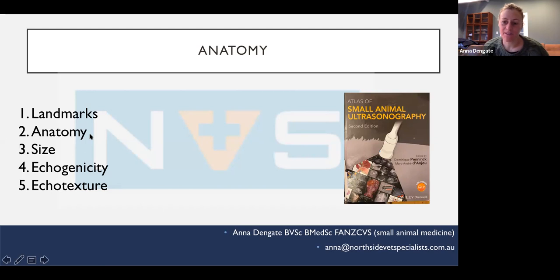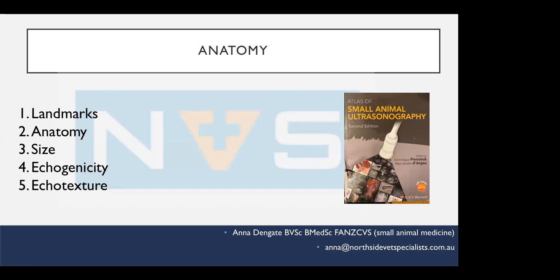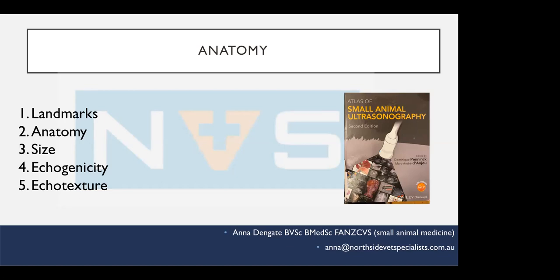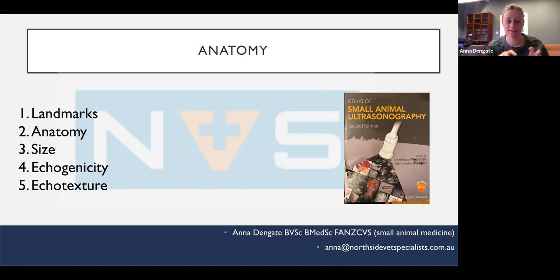And what about the liver itself? Does anybody know the lobes of the liver? Caudate. Excellent. The caudate one is the one that contacts the right kidney, so that's the one I was looking for before. Excellent. Quadrate. Quadrate wraps around the cranial aspect of the gallbladder, right at the round part of the gallbladder. Excellent.